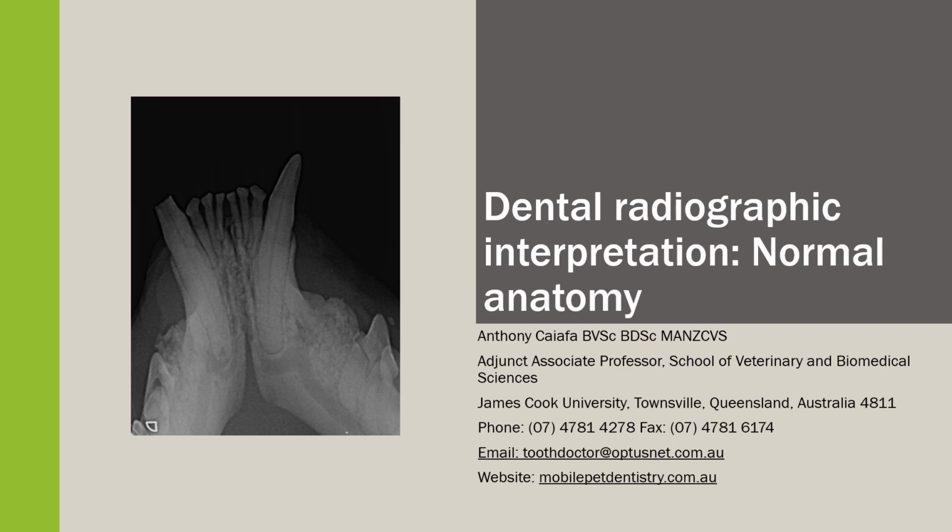If you can see on the radiograph on the left side, tooth 304, which is this one here, has a normal periodontal ligament space around it, especially at the apex. If you look at the tooth next to it, it has a crown fracture with the green arrowhead, and the yellow dotted circle shows that there is periapical lysis and periodontal ligament widening around the apex of that tooth.